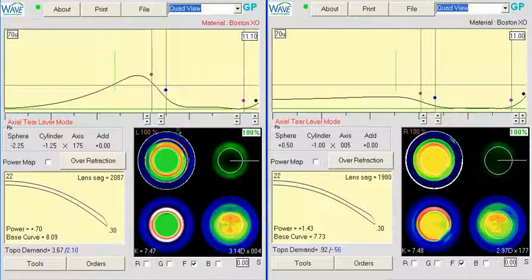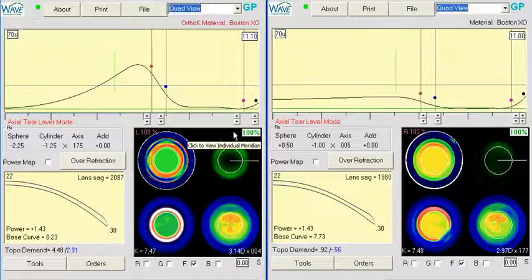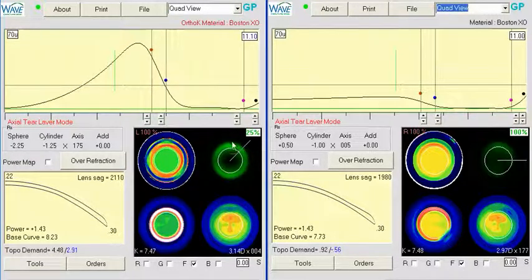So in 100% mode, I'm just going to click up here, and you'll see we're increasing the space underneath the reverse curve all the way until we get to about 1.4, and that's pretty close. Now the other thing I'm also going to do is in 25% mode, go through the different meridians and make sure that they're all pretty close to 1.4.